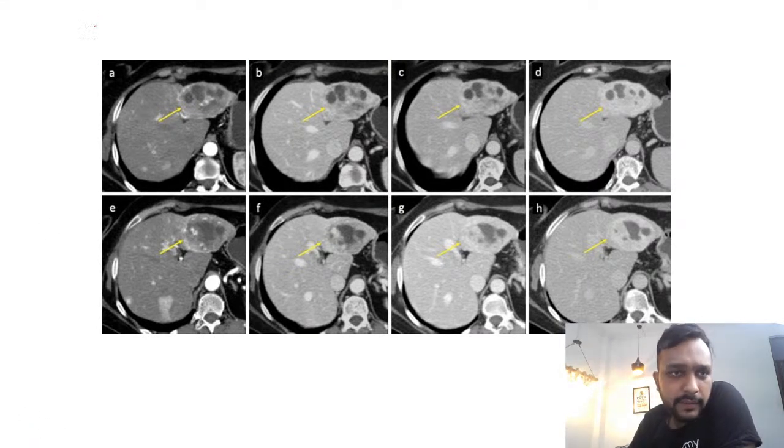So here again guys, this is a case of triple phase CECT abdomen.